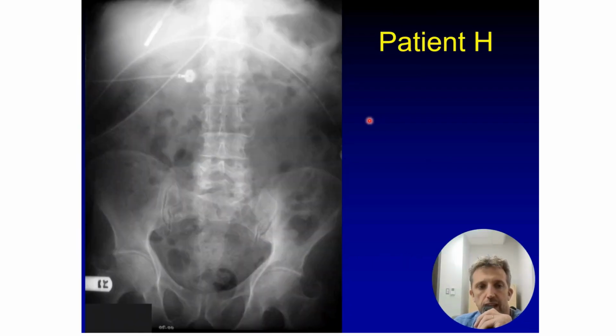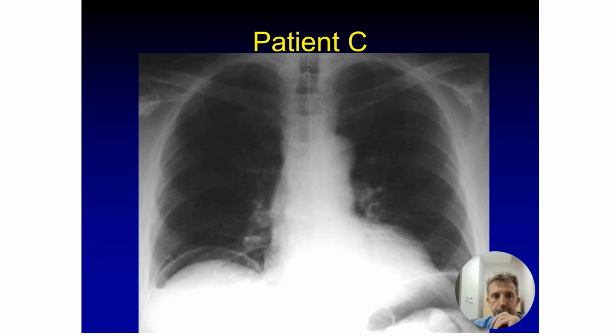Okay. How about this patient? Stones, bones, mass, and gas. Anything radiopaque? These are EKG leads, but what is this thing? This might be the most important radiograph we see today. July 1 new interns. This is a feeding tube in the right main stem bronchus. That needs to be repositioned. Everything else is okay. Don't miss that.